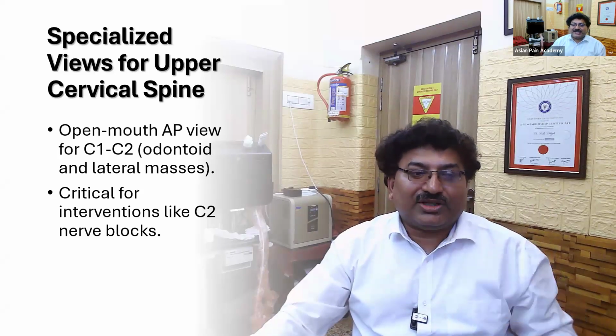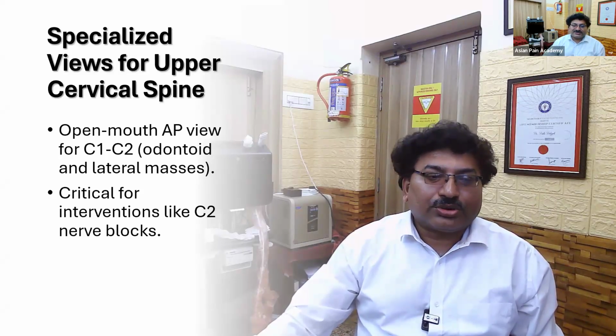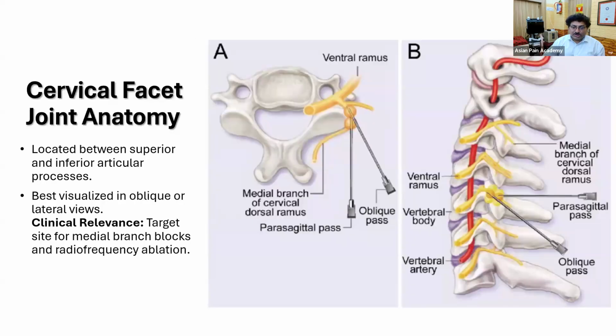Now there are some specialized views. The open mouth AP view of C1, C2 shows the odontoid process and the lateral masses. This looks like this. The open mouth view can show the lateral masses and the odontoid process clearly for C1, C2. Nowadays it is not much used, but definitely it is very important.